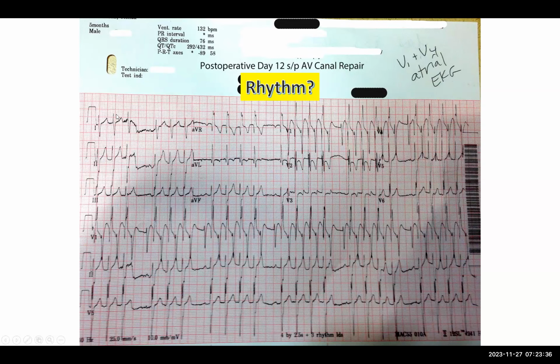So I think we would agree this is a QRS, right? Yes. And so we know that everything on this page is simultaneous. That's the way this particular EKG machine works. You should always be aware that there are some that put the rhythm strip as a different strip than what's actually happening above, which I've never understood. But thankfully, ours are programmed to all be simultaneous. So this is clearly the QRS, and everything else we look down from there is not.